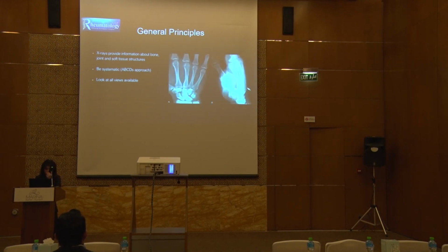Okay, and this is another patient who was drunk and punched the wall with his fist, and then he came with pain and swelling in the wrist. Because of the trauma, we won't rule out a fracture. This is his AP view X-ray, which looks unremarkable, and he has pain here. But this is the lateral, and you can see here, I don't know if it's obvious, there is like a hairline. Do you see the black line? This is the fracture.